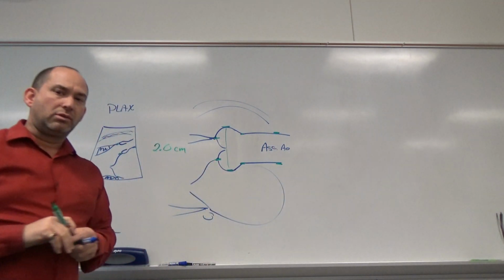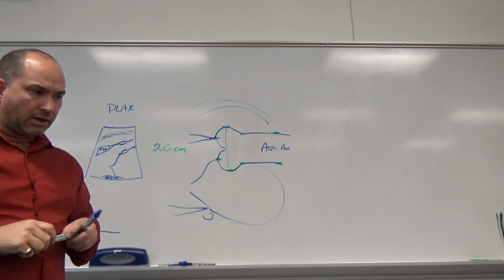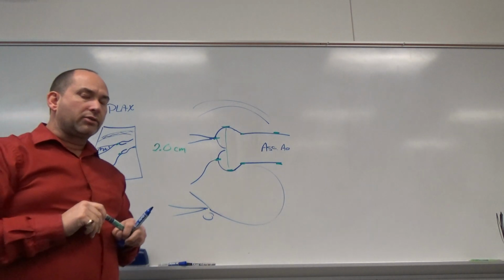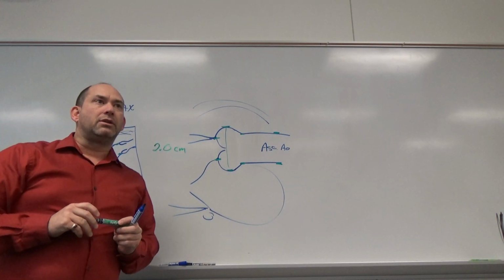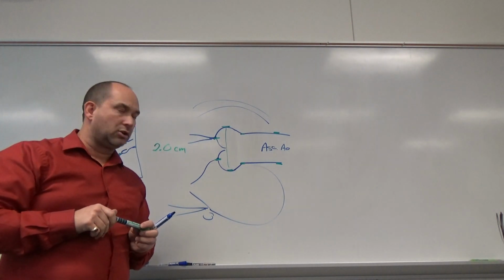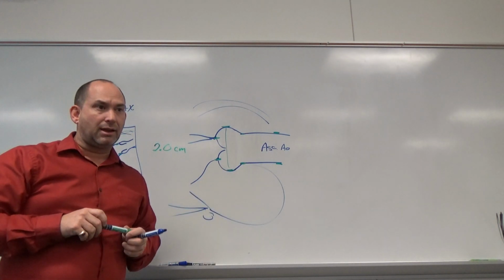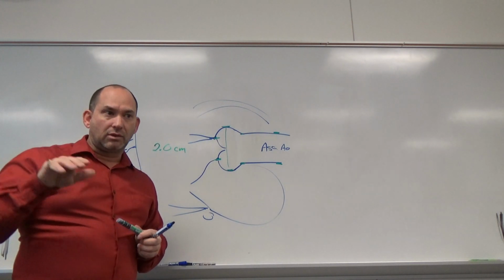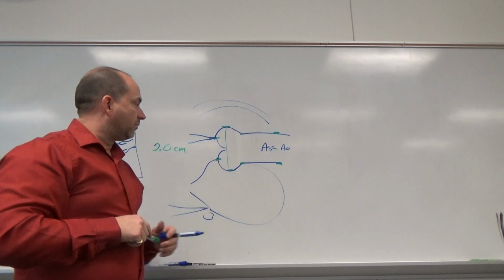I personally want us to do this outer to outer. It should probably be done at the end of diastole. There's not really a consistency for adult echo when they measure this as far as the timing goes, but it's also found that to get a good size measurement would be best to do it when it's fullest, and that would be during peak systole. Pediatric labs do peak systole, many adult echo labs do it end of diastole because that's the most consistent stage, because systole can change depending on the load of the heart. So that's what we're going to look at.